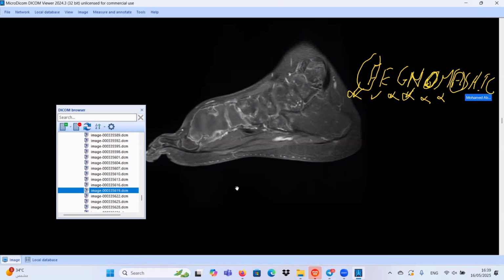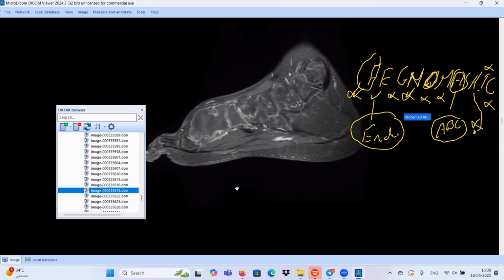What do you think? Aneurysmal bone cyst, maybe. Maybe there were some fluid levels, but less likely. I agree with you, because fluid level is much less, I think we have here one or two fluid levels. So aneurysmal bone cyst and enchondroma are in our differential. Is it brown tumor or hyperparathyroidism? I think no. Is it infection? No. Is it chondrosarcoma? No. So enchondroma and aneurysmal bone cyst, and I think you also said spina ventosa, are among our differential diagnoses.